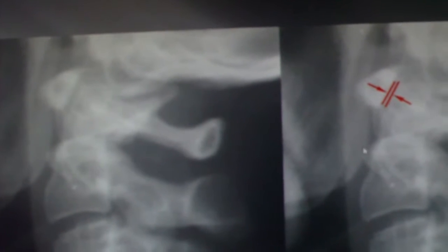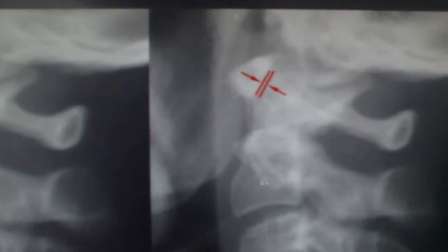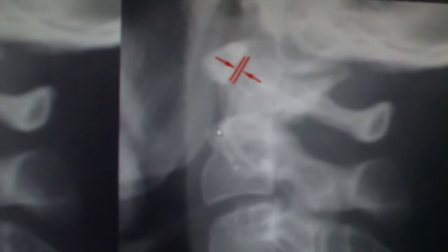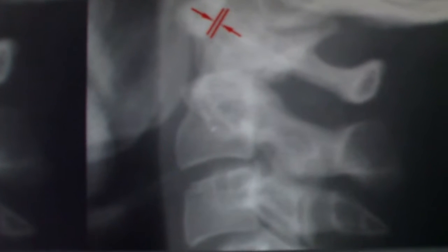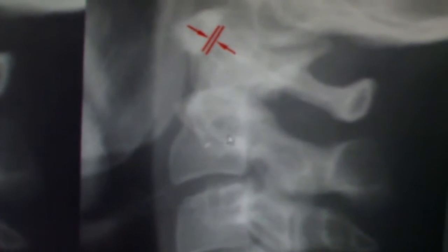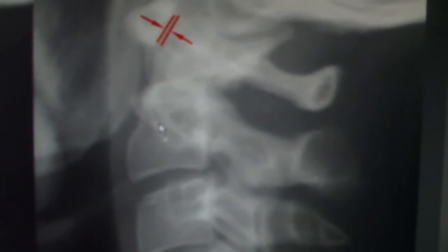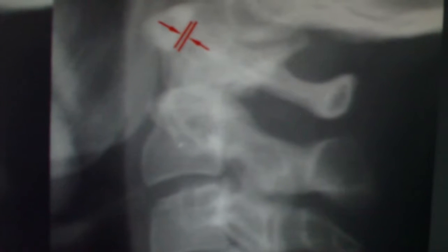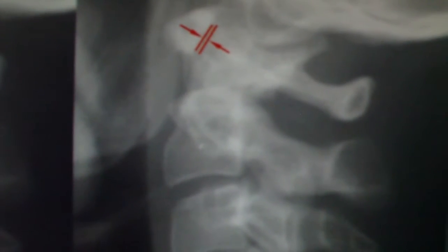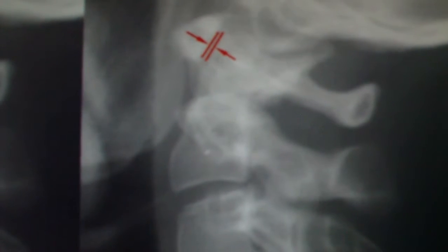This is a little tubercle on the anterior aspect of the vertebral body, but we also have some rotation here, so part of this little bump here is because of the transverse process. Right? The foramen transversarii, if there's a little bit of lateral bending, you might could see because the transverses of C2 point down, and if you laterally bend, then you're going to shoot through the foramen transversarii. You can see the way.